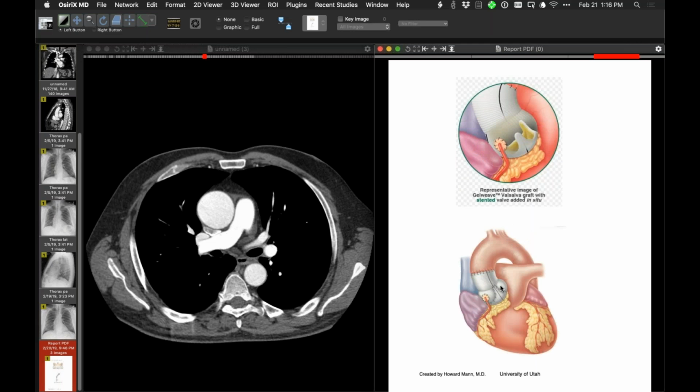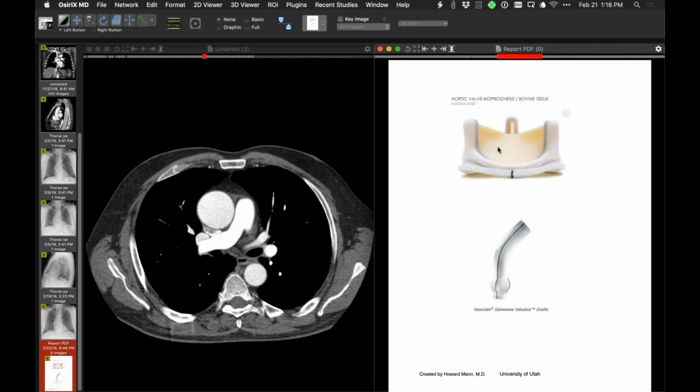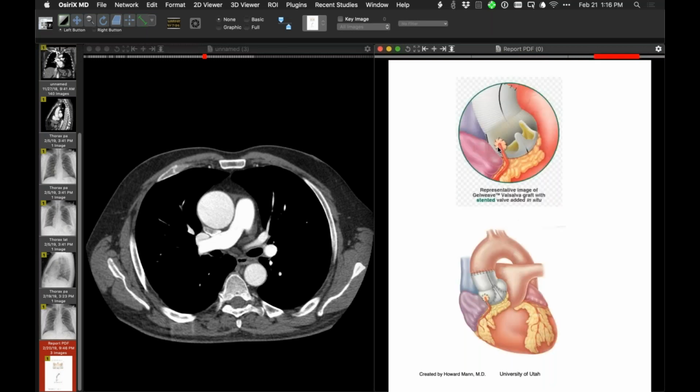And then, of course, they put one inside the other. So basically what you end up with is, here is the Valsalva graft. Inside of it is the aortic bioprosthesis. And then they create or take coronary buttons and reimplant the buttons into the graft, so that we end up, in this case, with this kind of anatomy using those two devices. So cool. That's a Bentall.